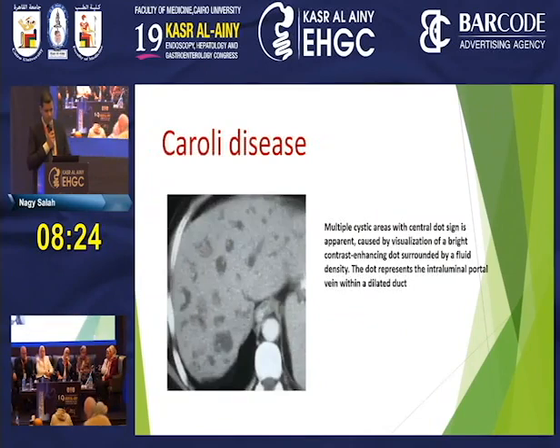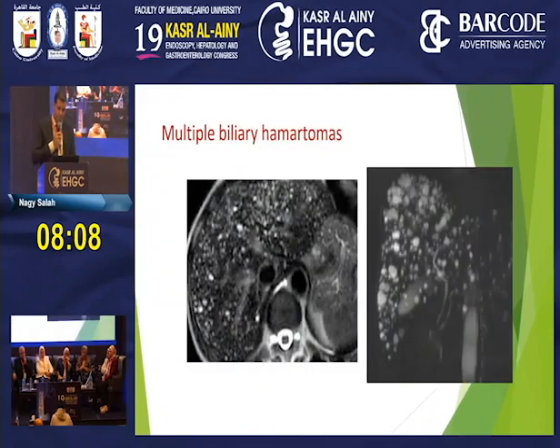marginal enhancement. Caroli disease: multiple cystic areas with central dot sign caused by visualization of a bright contrast-enhanced dot surrounded with fluid density. The dot represents the intraluminal portal vein within the dilated biliary duct. Multiple biliary hamartomas in MRI.